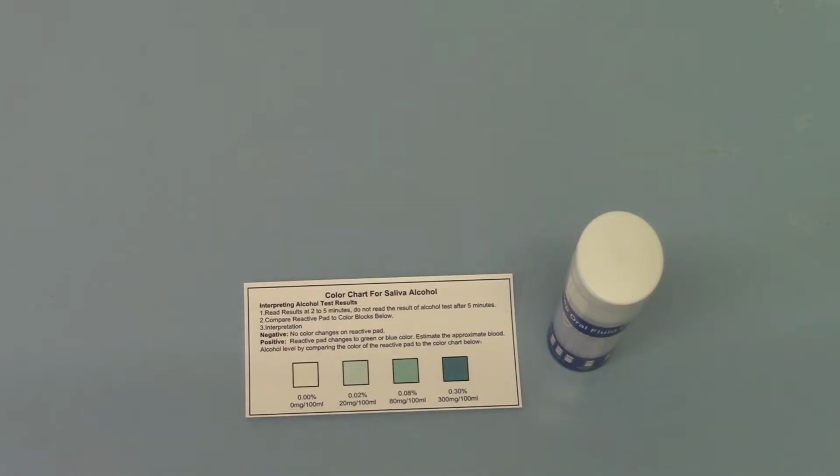So there you have it. That's the new Nobex 12-in-1, 12 plus alcohol. It's a very comprehensive, easy to run, reliable saliva drug screening kit that really procedurally doesn't throw any problems. The key element we spoke to you earlier about is getting an adequate and good saliva sample and rubbing the swab around the mouth to collect any drug residue that you're going to pick up nicely with this.